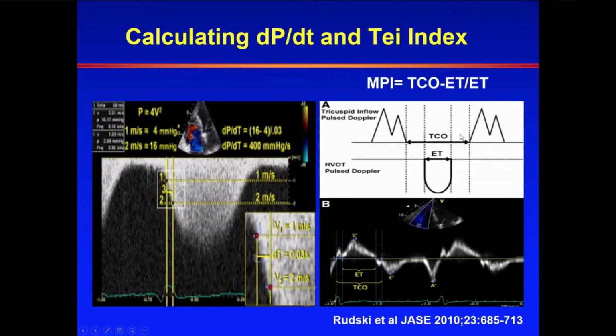One caveat for relying on the myocardial performance index, as you see in the numerator, it includes the isovolumic relaxation time. And so a patient with a high right atrial pressure, but still with RV systolic dysfunction, can have a short isovolumic relaxation time and a small value. So that can lead to misguided conclusions about RV function. Because it involves multiple measurements, and you can see it is rather tedious, and I have to look for RR intervals matching, this approach is not really used by most labs, perhaps mostly used for research.